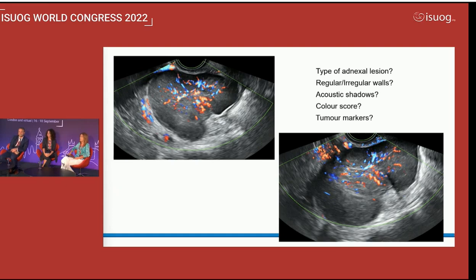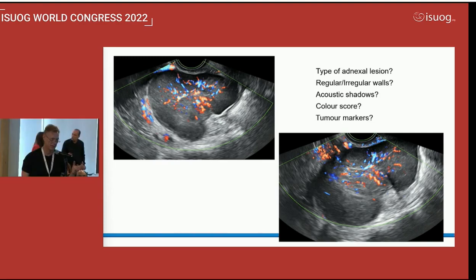Hi, I'm Magnus from Stockholm. You can see in this image, you have some branching vessels. Consider that as well, because that's what strikes you when you look at the vascularization. Exactly. It's not only a grade 4, but it's also a very branching tree of arteries and vessels. And because of that, what do you think?